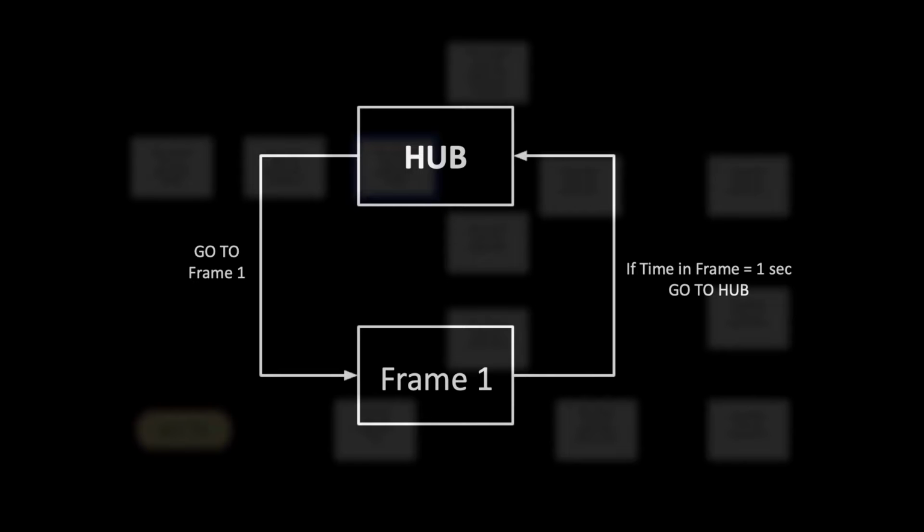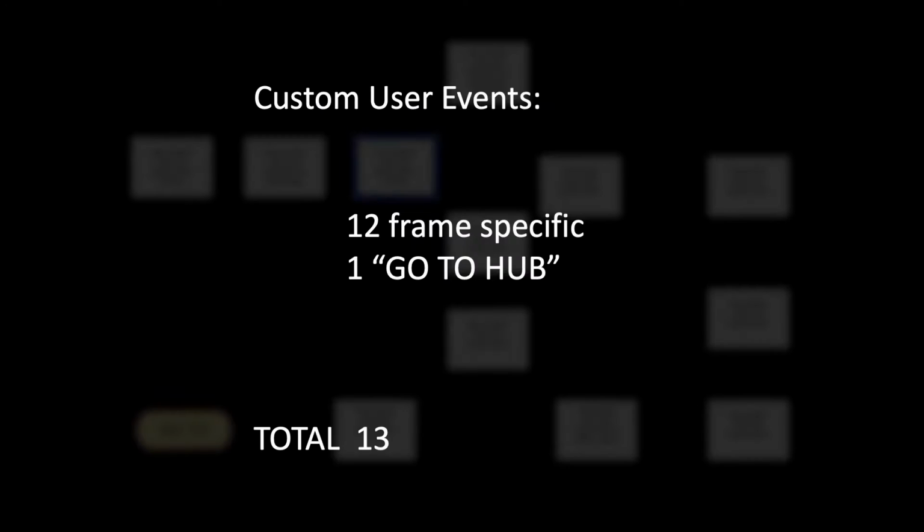So how do we go about doing this, you ask? We build the same number of frames, we connect them slightly differently, and we add an additional frame called the hub. Similar to the standard approach, each frame is programmed with all the mannequin settings, plus an additional setting that moves all of that information that was previously programmed into the frame to the hub.